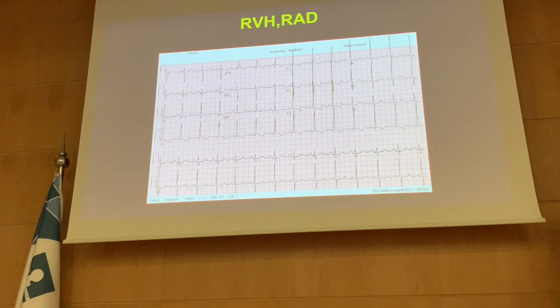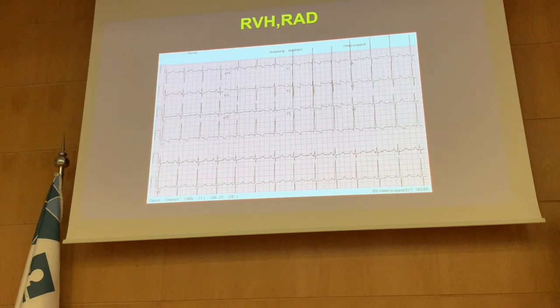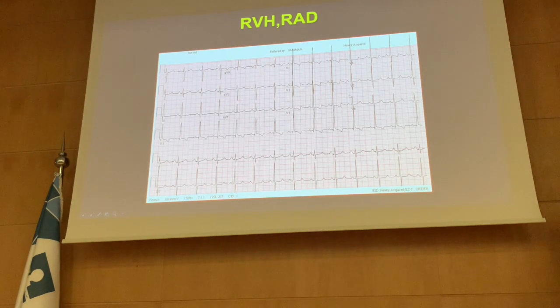It doesn't look like an M shape though. Yes, if it were an M shape, this would be a left atrial dilatation. But for this patient, scenario oriented and with the ECG, the P wave here is big, more than 2.5 millimeters, and V1 is positive. We said there are 7 differential diagnoses of positive V1. And this case is right ventricular hypertrophy plus right atrial enlargement. So in this case, this is also good. So she will answer.